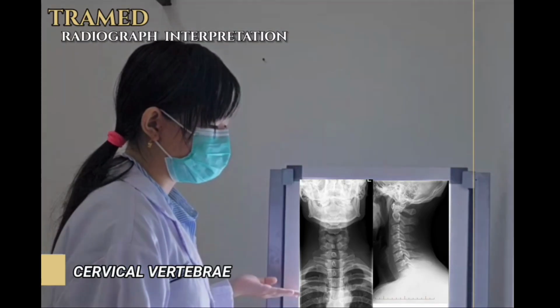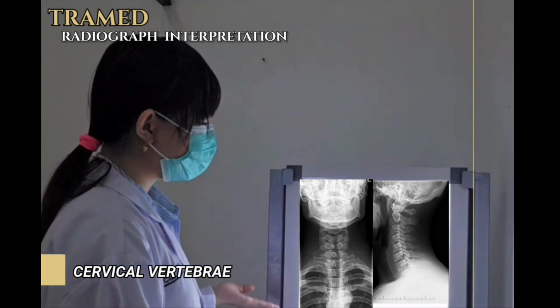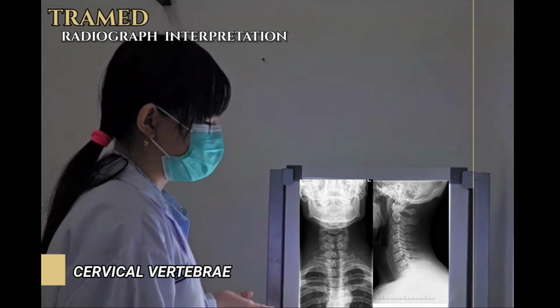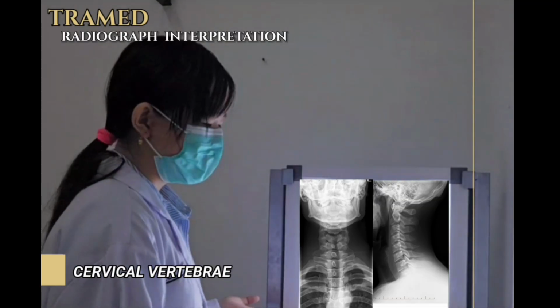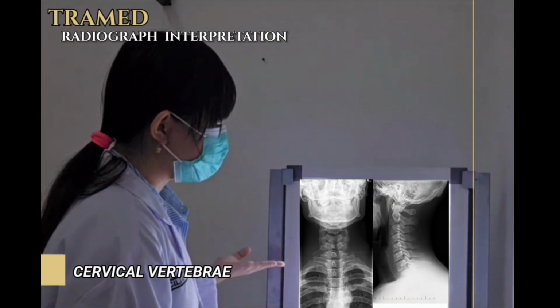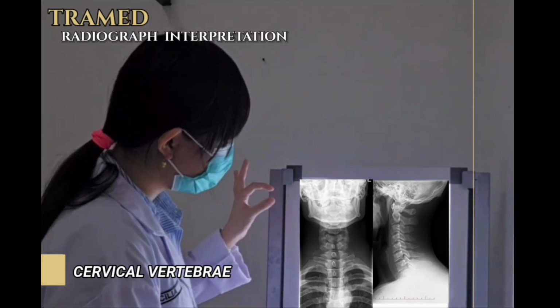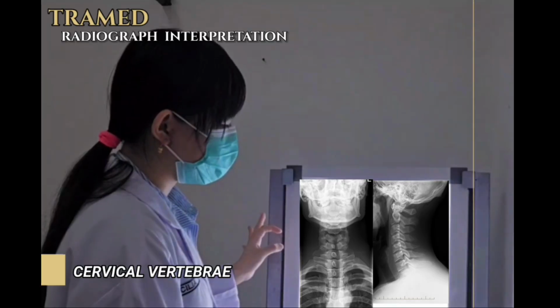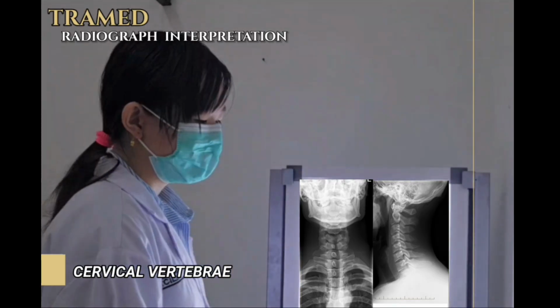And for the next, we must check the cervical vertebrae. First we evaluate the image adequacy of the cervical AP. For the cervical AP, the adequate penetration is normal, and the spinous processes are midline, which we can see is normal. Equidistant pedicles are symmetrical and there is no rotation.